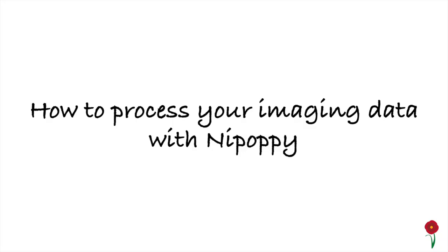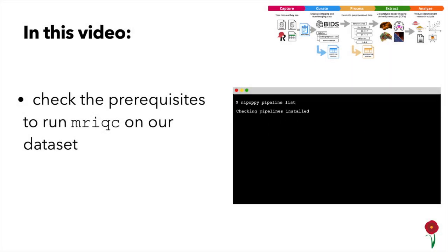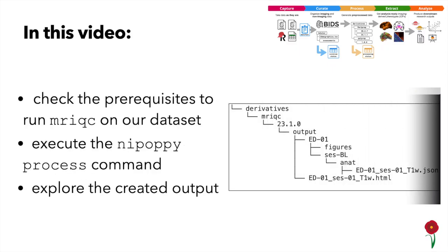Welcome to this Nipoppy tutorial. In this tutorial, we will cover how to run processing pipelines on our BIDS data with Nipoppy. More concretely, we will check the prerequisites for running MRIQC on our example dataset, execute the Nipoppy process command, and explore the pipeline output.